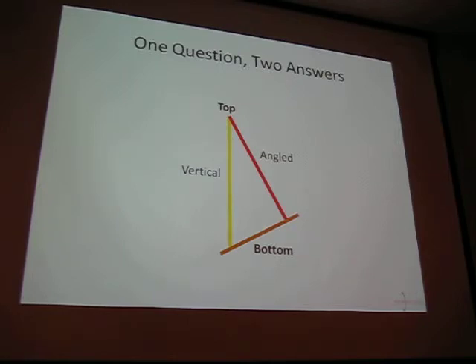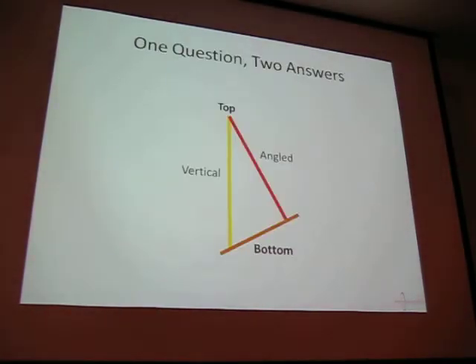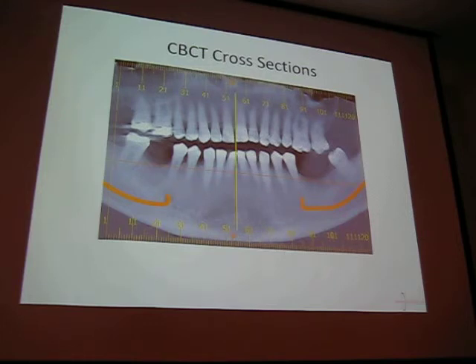So how are these CT slices made? How did I make that slice for you? Well, we start off at the midline, and then we start with parallel slices going back a millimeter, and they slowly go back. Right? That's how slices are made. We see them all the way back. Two light bulbs just went off. This is the part I love. So right, if we're placing implants here and here, this is your slice. That's when you get to measure.